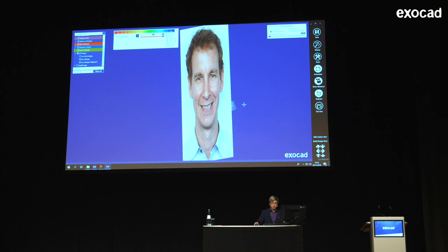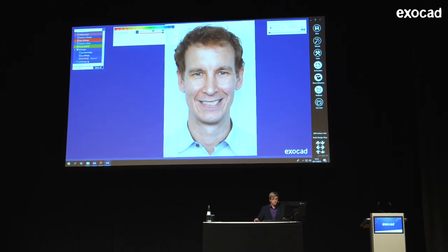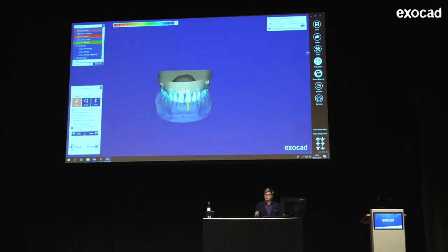But now I tilted the picture, and I get automatically here a smile design view, which sets the direction back to the view of the smile design. You can also get this view by just double-clicking on the picture itself. So, but for now, I'm hiding those pictures and deactivating the true smile, because now I'm trying to work on the abutment a little bit more.